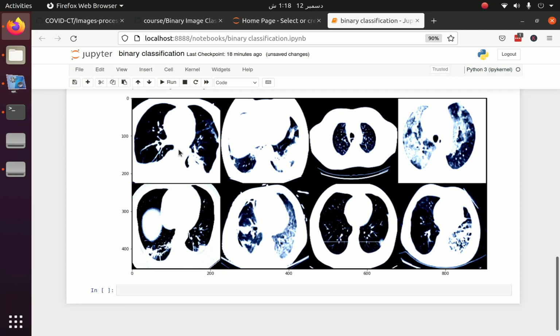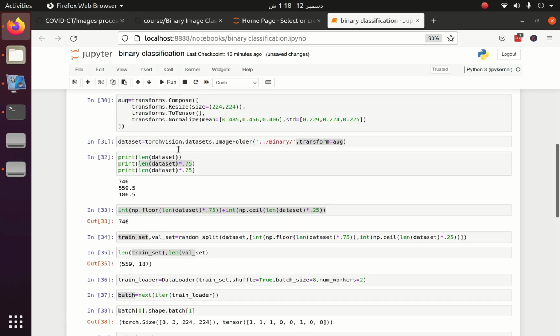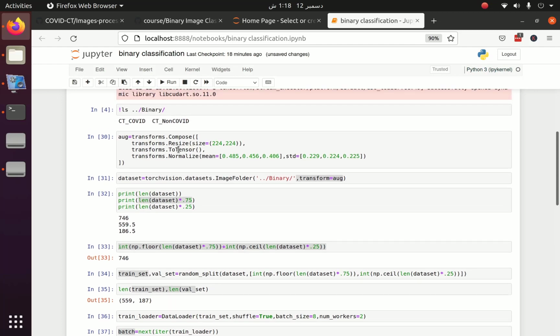So this is part 1, where we have seen how we can load data, how we can plot data, and what is the benefit of using augmentation, because we want our image in tensor format and it helps us to avoid overfitting. We will use further transformations such as flipping and rotation when we build the further parts of this tutorial series, and how we can split this data. We have seen this in this section.